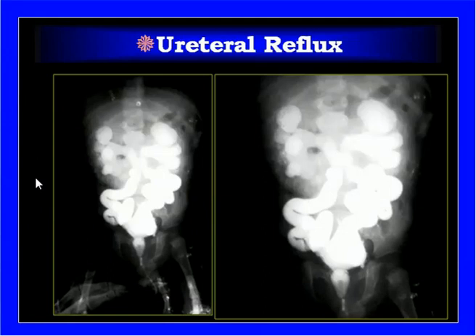This is another case of posterior urethral valves. If you look at the lower segment, you can see a structure which appears like a spinning top, and both the kidneys, both the ureters are grossly dilated. These are called the mega ureters, and the renal system is again moderately dilated because of the obstruction at the posterior urethra. So this is the case of posterior urethral valve.